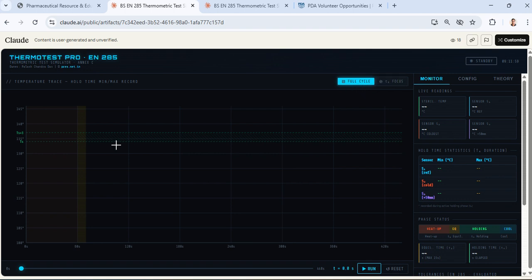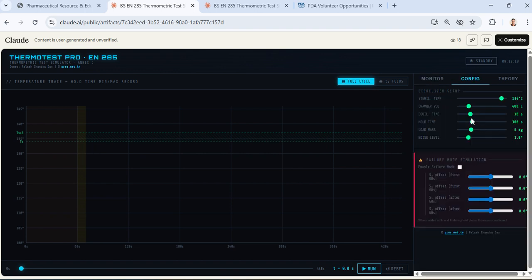This is for the full cycle, where you see the full length of the cycle, the full graph. And this is called T2 focus. T2 focus will focus on your equilibration range, what you see here as a yellowish band. If your equilibration is more, you see the band expanding and again shrinking. So you are able to set how the band should look. So this is for tutorial purposes.